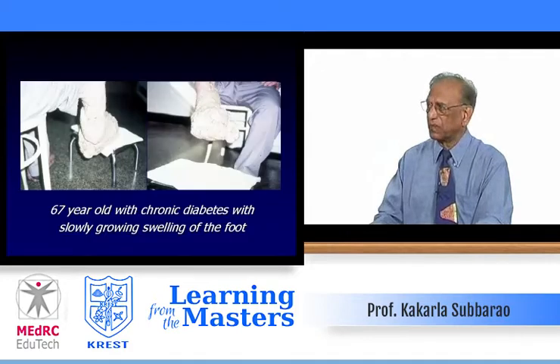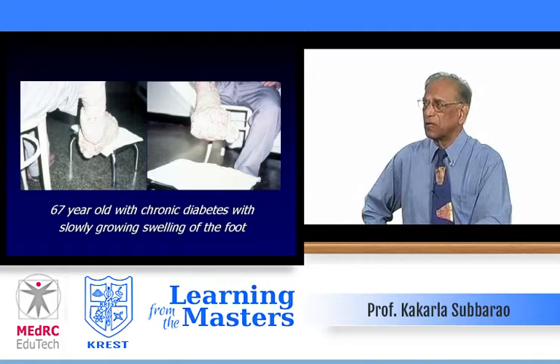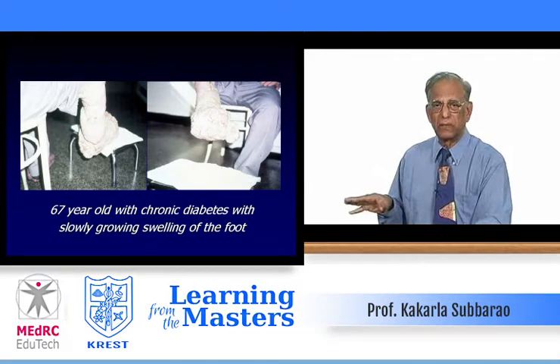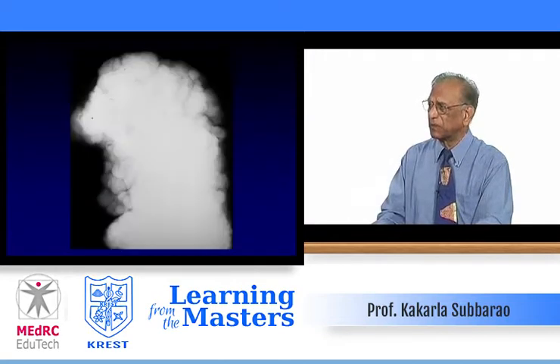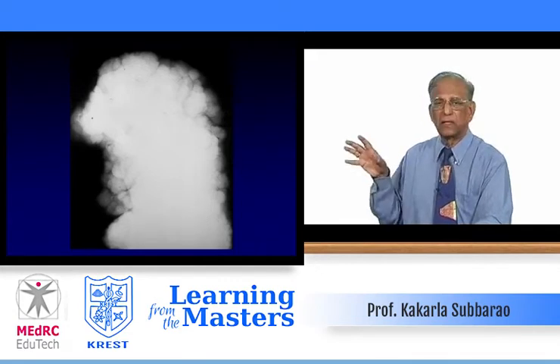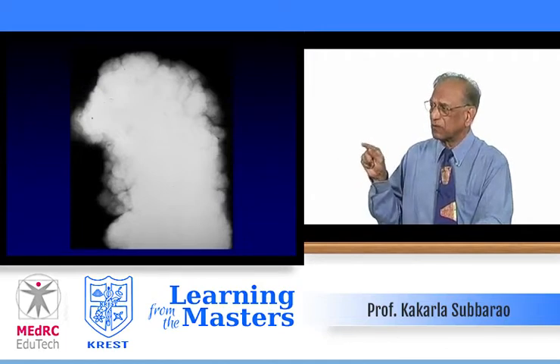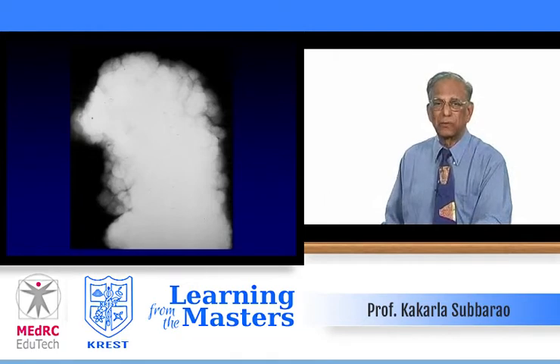This one, a 67-year-old with chronic diabetes and slowly growing swelling of the foot. Clinically you could see it's a nodular type of swelling of the foot, not just edema. This is the radiology of the foot. What do you find? Well, this is a rather not a penetrating film, but still to find out the soft tissue lobulated nodular masses. Could be Kaposi sarcoma, could be neurofibromatosis. Let us see.